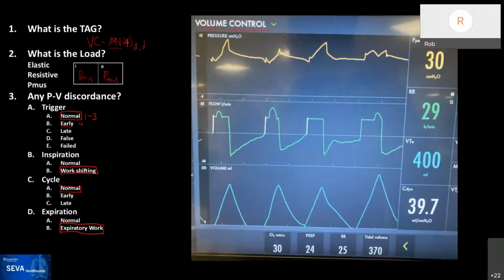Samid asked, it's hard to tell if it's IMV type 1 or type 4, and I told him you can't tell by looking at this particular screenshot. You just have to know that dual targeting on the Servo will give you, in some cases, a spontaneous breath. So that last breath, number 4, if that had been patient triggered, it would have been a spontaneous breath because it is clearly flow cycled, because the inspiratory time is noticeably longer, right? Yes.